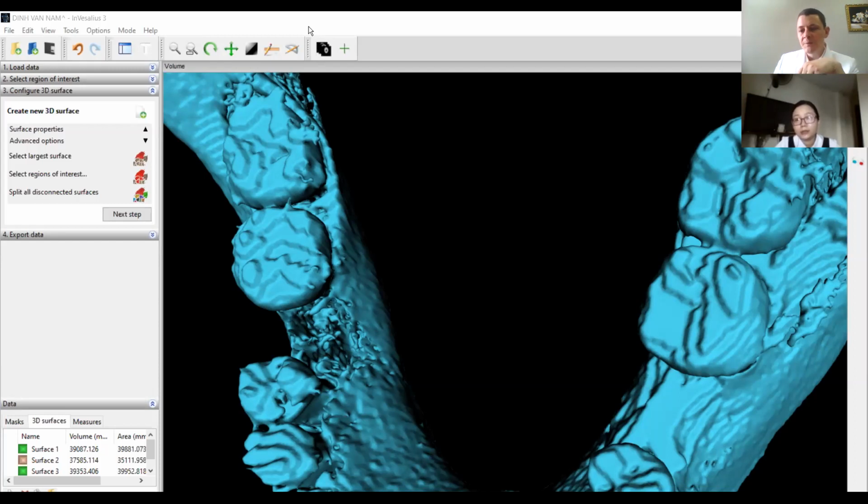And one thing, because I saw on the US group, European group, people who try this, and you have something which is very characteristic. It's the 7 is steep. The 7 is steep distally. Why? Because you understand that if I were to put a screw here and I try to push this teeth back, I will hit the cortical very soon. And when I hit the cortical at the level of the root, well, the teeth do like this.